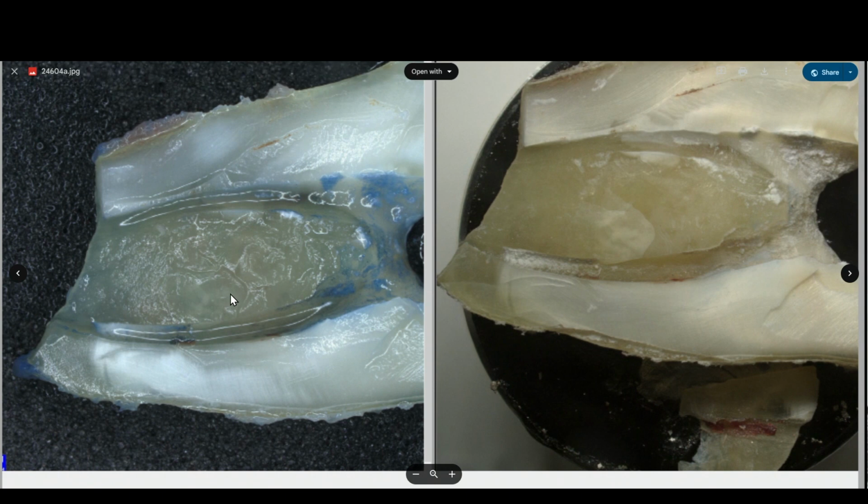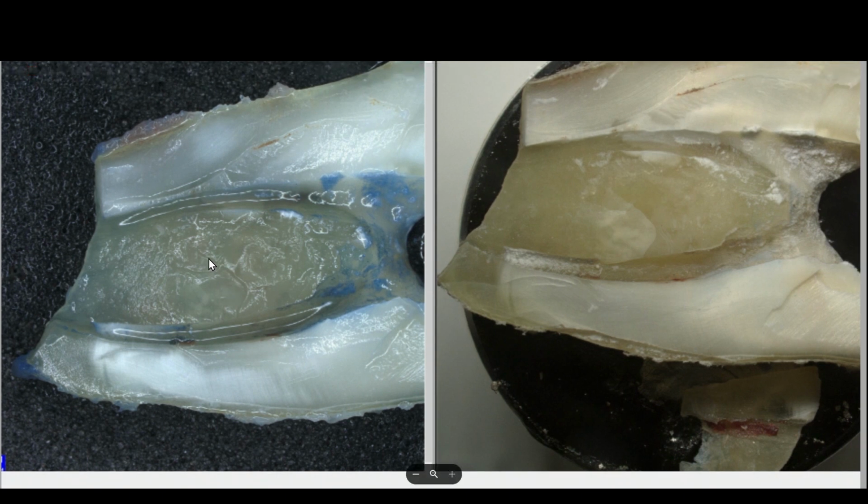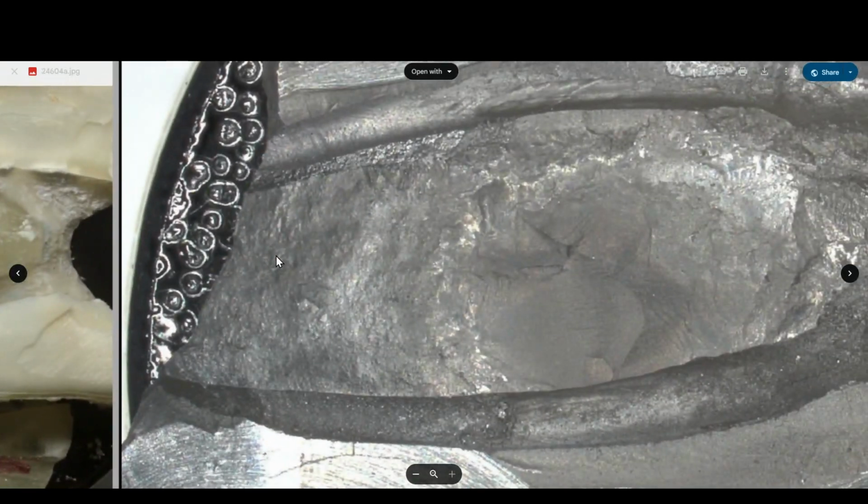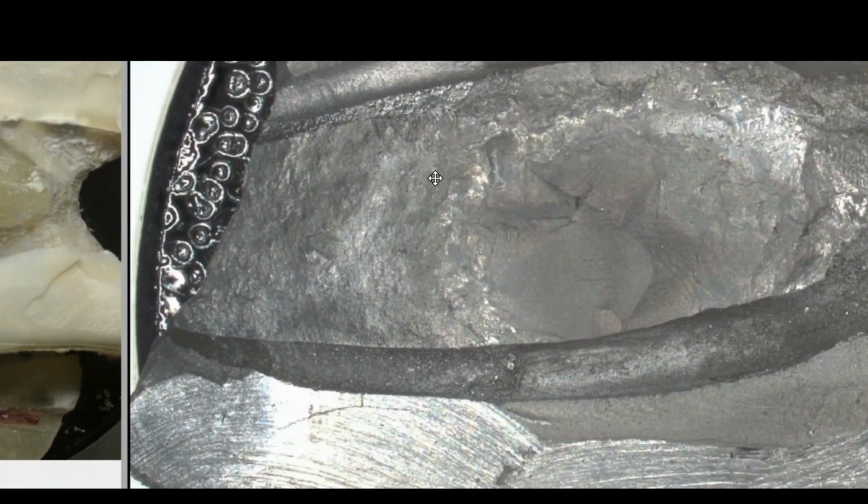For example, when you look at this Reed specimen, in the top canal, you can see the sectioning has not entered into the canal, and we get a very clean section. On the bottom, the sectioning has gone into the canal, and there you can see debris in the canal that you might mistake for material left over from the irrigation procedure. So I wanted you to have some understanding of how I select the areas to examine, because I want to avoid areas where there is this debris.